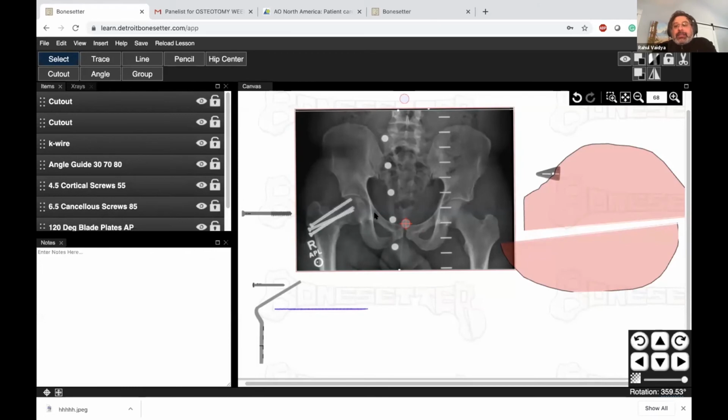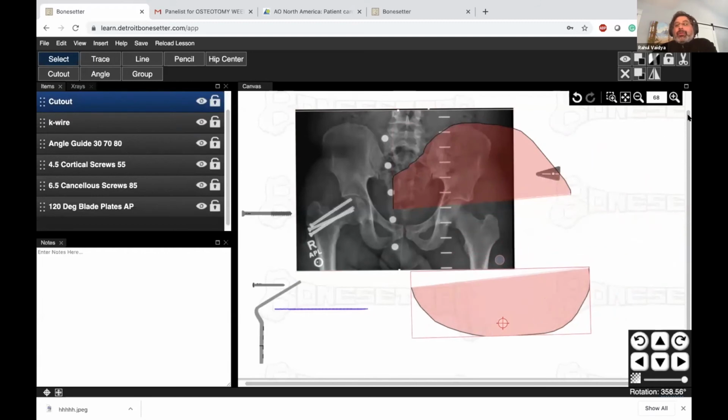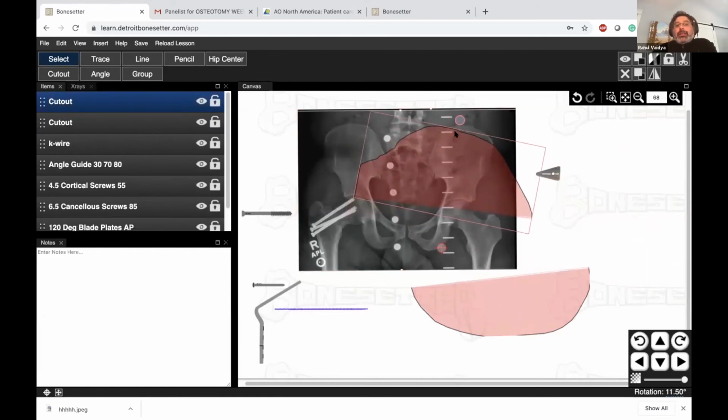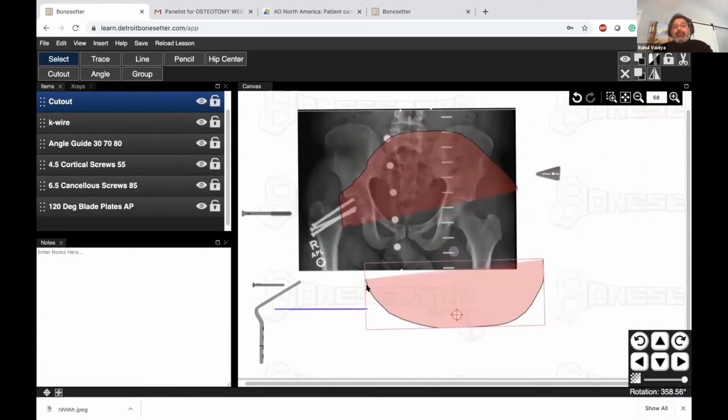The tools that I introduced to you today were the trace, and the reverse. You can reverse anything, like an X-ray. I also introduced the centering tool, which allows you to move any piece lateral or medial. I'm going to have the video up for you to do this at home. If you weren't able to do this, if you were, please save it.